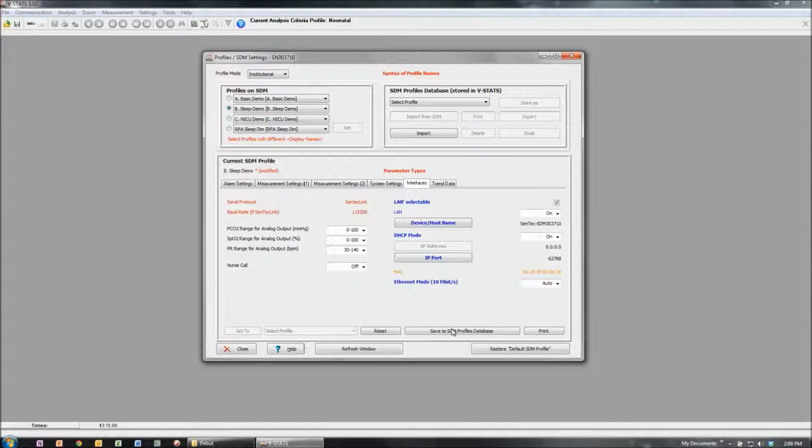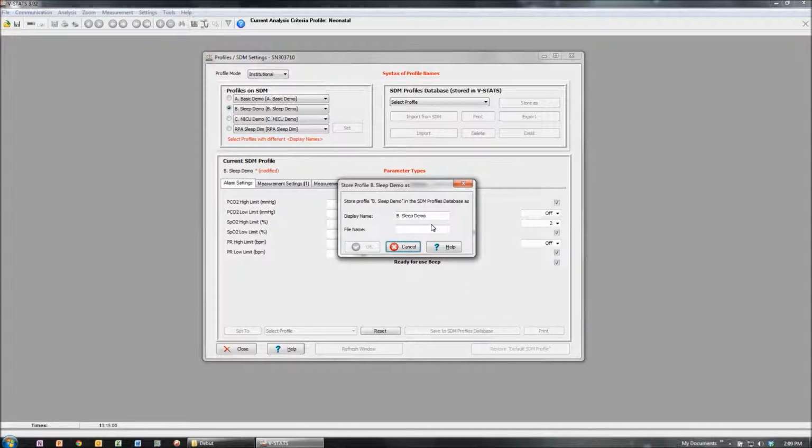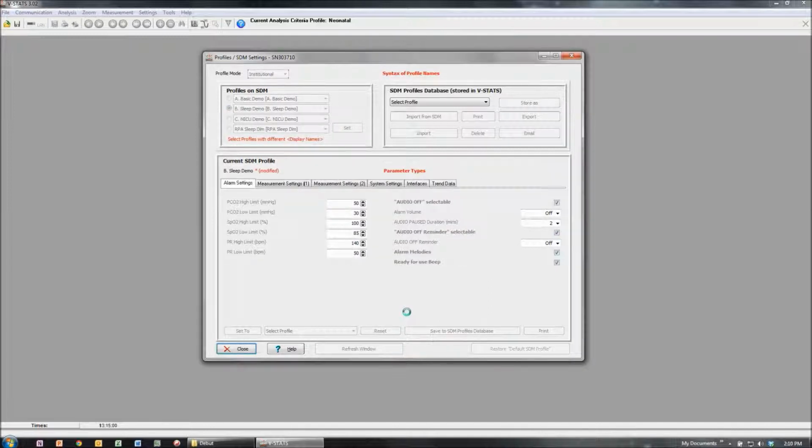Once we've set that up, so that's our new profile. We've just set everything up. We're going to save that to the database. Just going to say, what do you want to save it as? And I'm going to say new profile for video. I'm hoping it'll fit. No, I'll just put vid in there, vid. Okay, now I generally just make the file name the same as the profile name to avoid confusion, and we go OK, and that's now saved us a new profile.